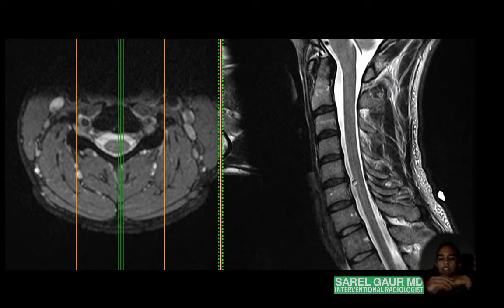So search pattern is really going to be dictated by what you're most likely to see in practice. So you sort of have to have an idea of what types of diseases you're going to be trying to see in practice. When I was at an academic medical center for training, I saw a lot of different things. We would see some, quote unquote, crazy things.